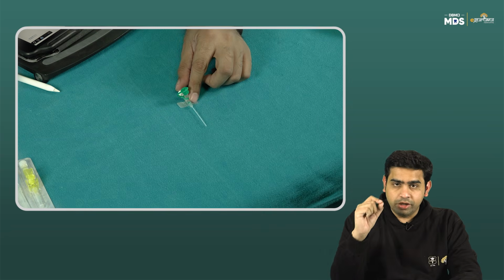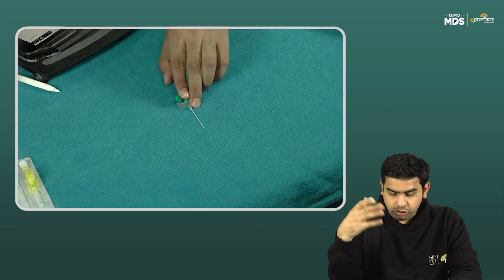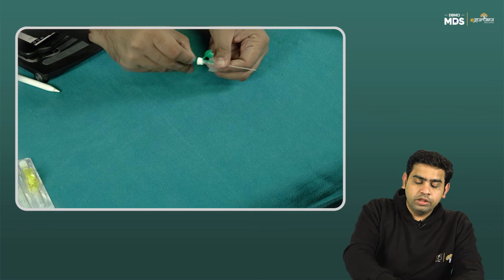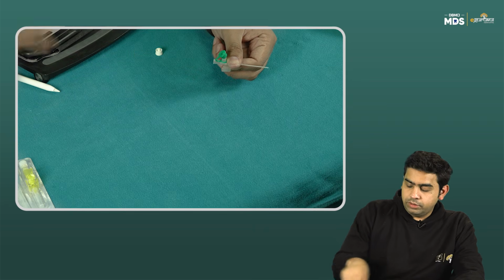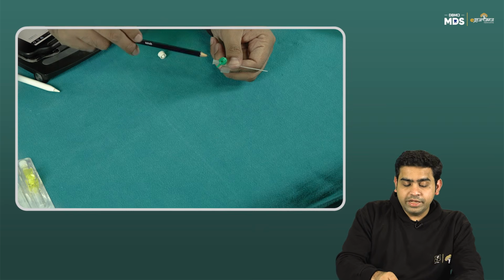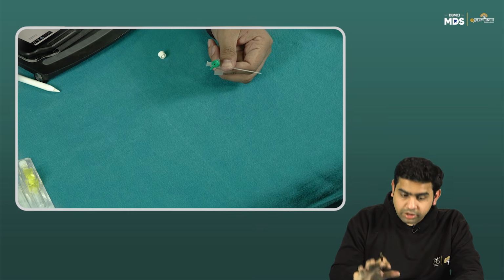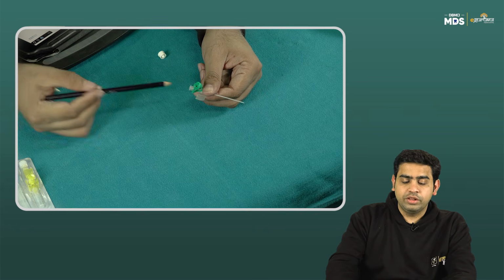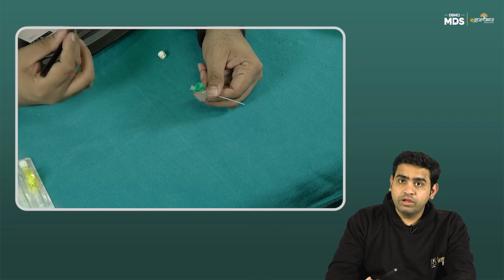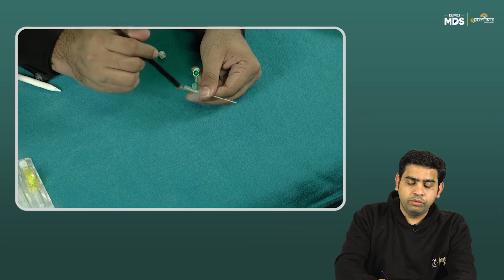Now, what you need to understand is that many of the sisters, or I don't know whether you give the injection or the sisters give the injection, but many times they give the injection from this port only. They basically remove this luer lock and then give the injection through here. No, this is ideally used for giving crystalloids, or let's say a blood transfusion. That is what should be given from this port. But if you want to give an injection, this should be given from this injection port site.